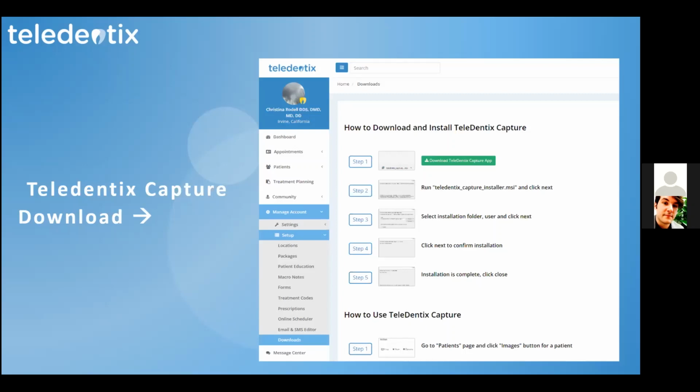When you download a document, you always see it on the lower left or lower right-hand side of your desktop dashboard at the bottom. So you're just going to click on it, and it's going to walk you right through it. It's a setup wizard where you literally just click next, next, next, accept, next, and finish. And that's pretty much it.